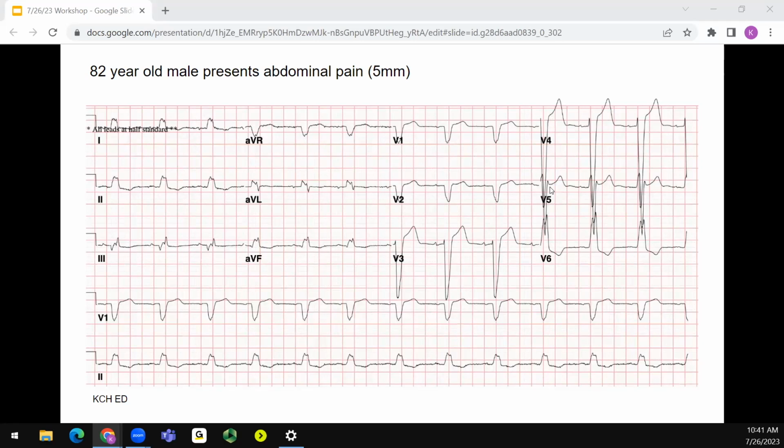Another thing, at Downstate EMS will bring you the EKG that they did when they called the pre-notification, and you'll see V3 maybe has the elevation that you see here, but it's completely cut off how far the S wave is going. You usually have to wait till you get your own to see how far the S wave goes, to see if the ST elevation is appropriate or inappropriate. All right.